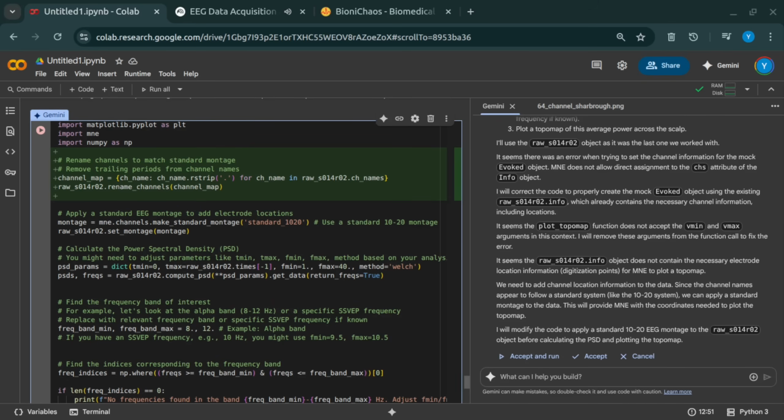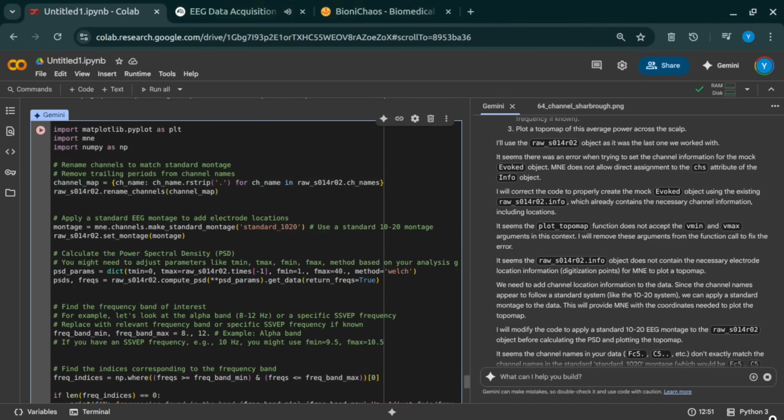And this is where maybe that other library comes in, the WFDB one you mentioned. Could that help? Potentially, yes. The WFDB Python library is specifically designed for PhysioNet data. While it's often used for reading signal data or standard annotations, sometimes header information read via wfdb.rdheader might contain clues. Or maybe the library has functions specifically for related annotation or event formats used on PhysioNet. It's another avenue to explore.